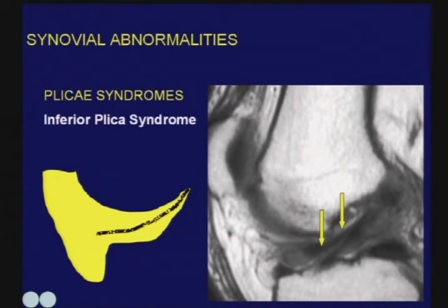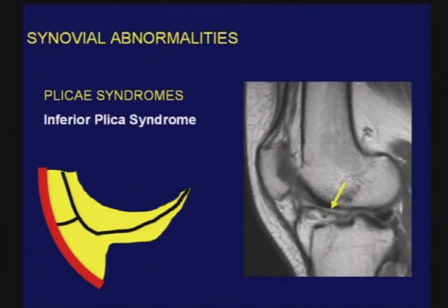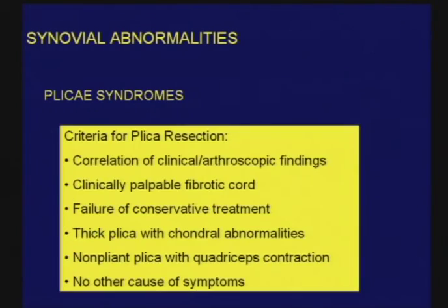As you look at this particular slide, you can appreciate that there may be another strand of tissue, because this plica can curve all the way up to the inferior aspect of the patella. In some cases, you will see strands of tissue extend down to the patellar tendon. Here's an example. This patient did not have arthroscopy, because certainly arthroscopy could do that, but this is thickening of that ligamentum mucosum with connections to the patellar tendon, maybe explaining contracture of the extensor mechanism.